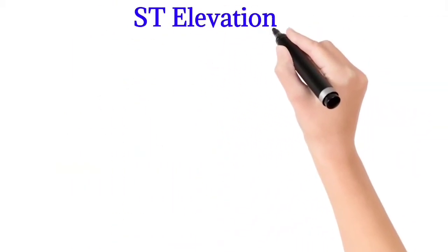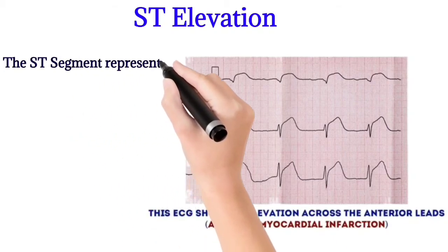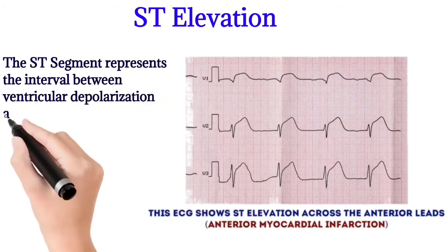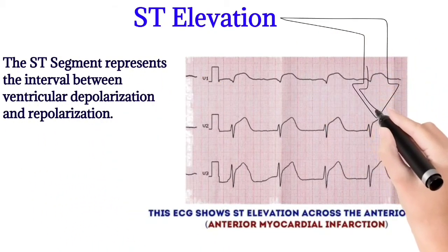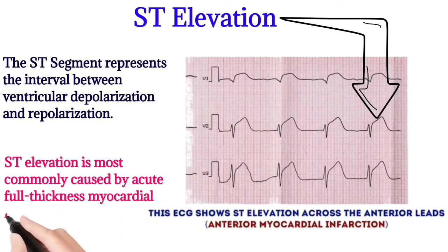ST elevation. The ST segment represents the interval between ventricular depolarization and repolarization. ST elevation is most commonly caused by acute full-thickness myocardial infarction.